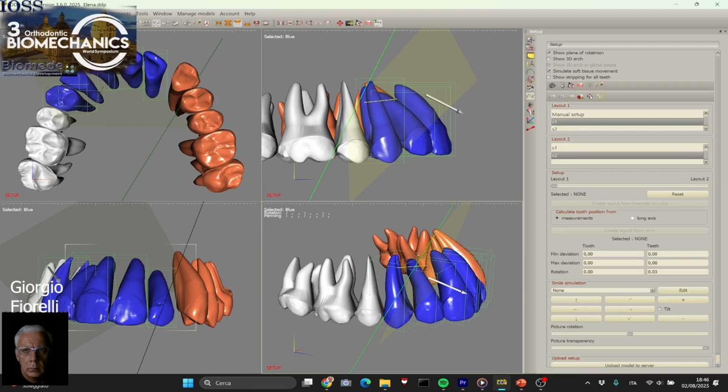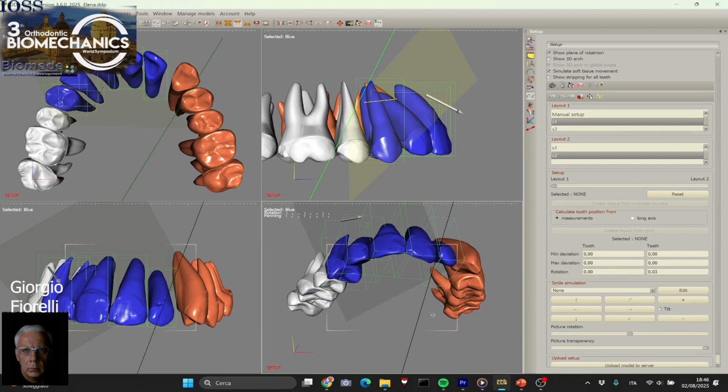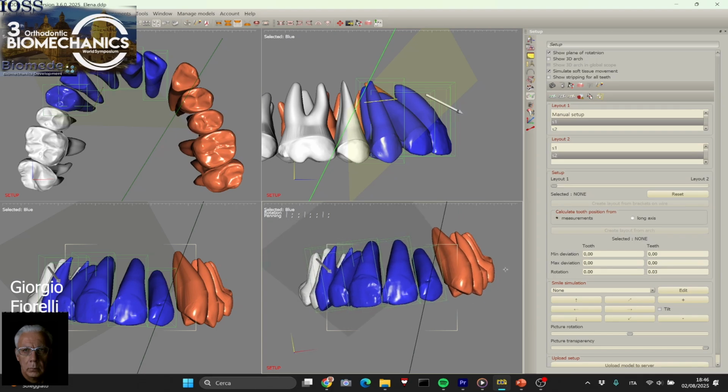Here we can, of course, rotate the models and see the force vector in all directions. Okay, so as you see, now we have a 3D representation of the needed force vector, and this is probably the main goal of our project, to find out in 3 dimensions the needed force vector, although of course there is some approximation for it.